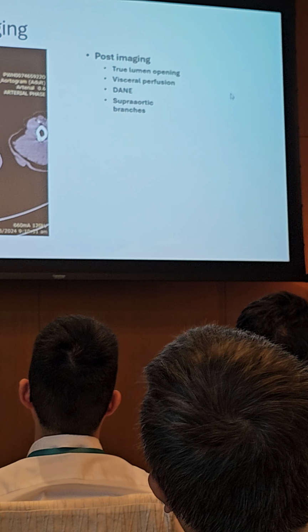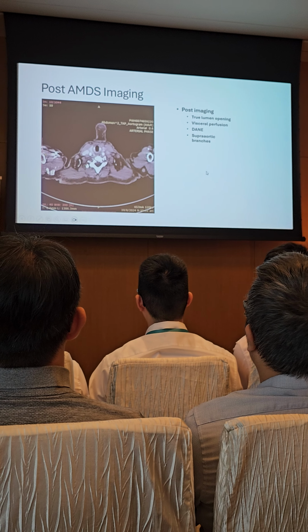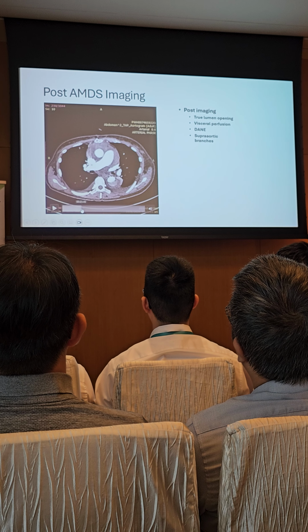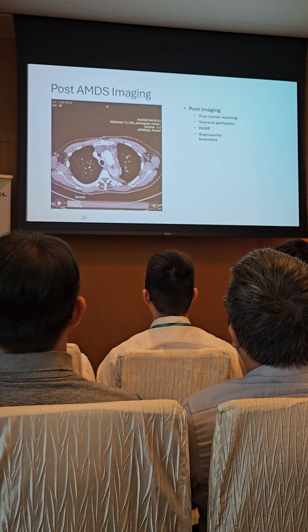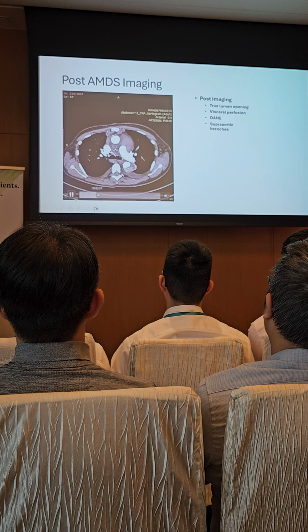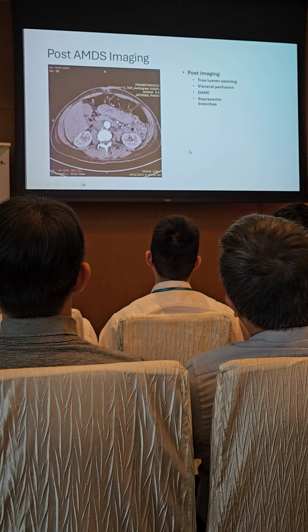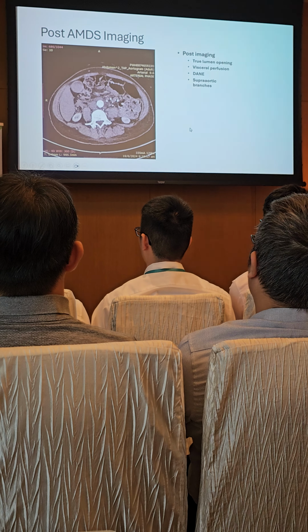So this is the post AMDS stenting image, where you can see very well the proximal. There is no dane, the true lumen opened up well. From some of our follow-up cases, we see further better remodeling in the 3 and 6 months post-op imaging.